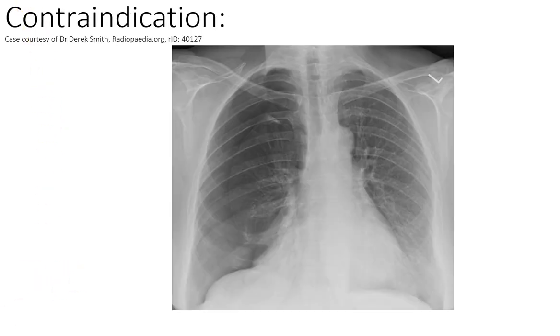Okay, so the other reason we look at x-rays is we're looking for indications, reasons to treat. Those reasons, for what physios can treat, are always consolidation and collapse. The other things we look for are contraindications. So it's really important to be able to recognise those.